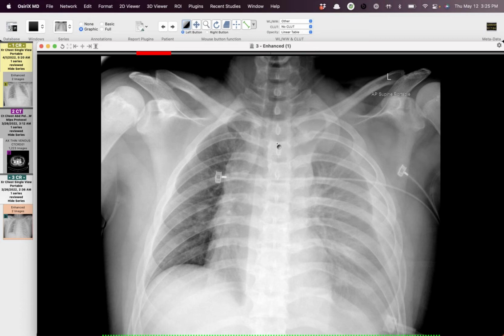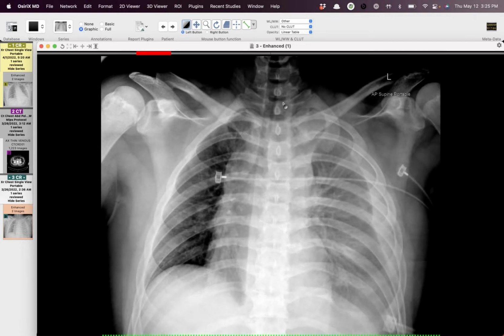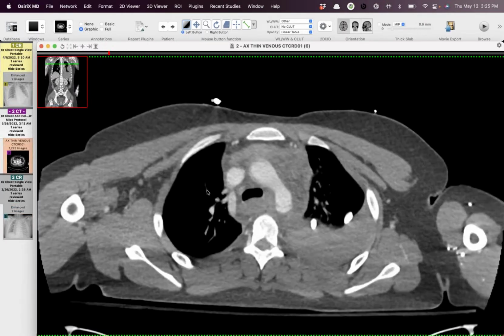But of course, in this case, we have other findings, the trachea being shifted way to the right and the left main stem bronchus being depressed. We've kind of lost the aortopulmonary window in the left PA here, but in good technique here, not a lot of rotation. So you'll see that this was quite the aortic injury.